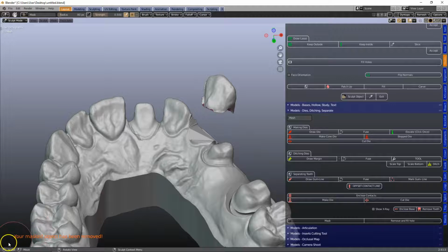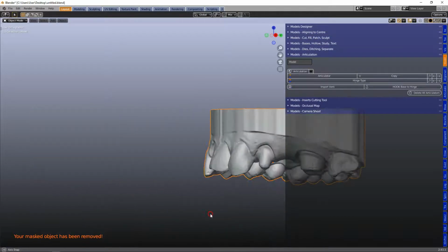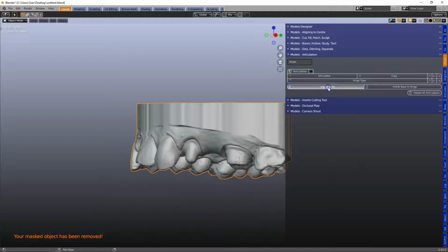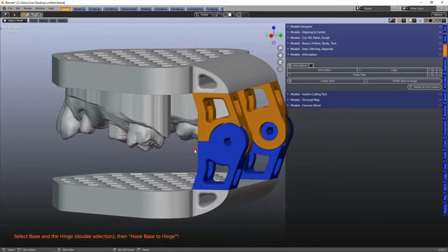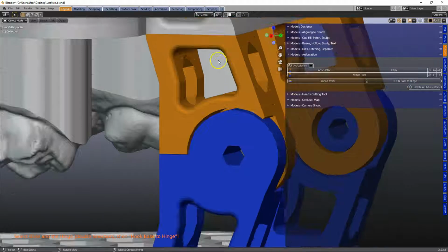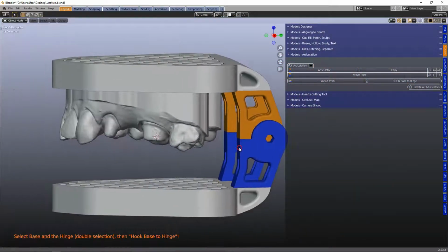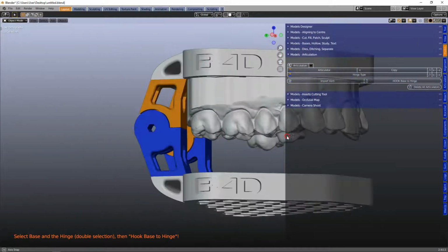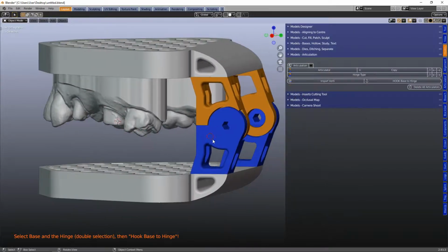Now the articulation, the only difference is that the Verti articulator has been redesigned by Ivan, and he's done an absolutely amazing job here. The geometry is a little bit different. And everything else stays the same.